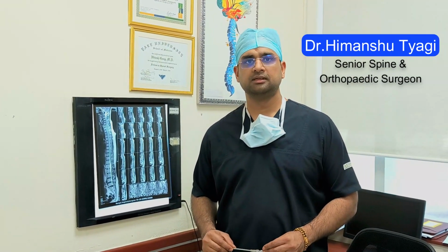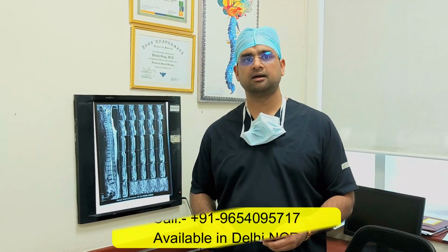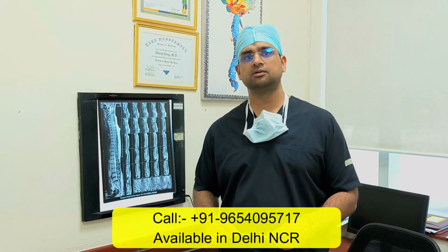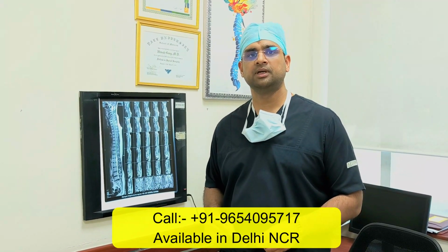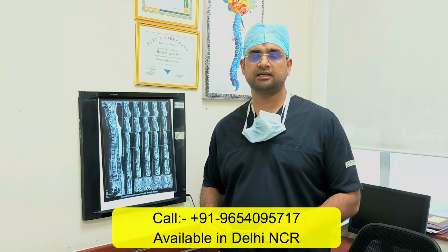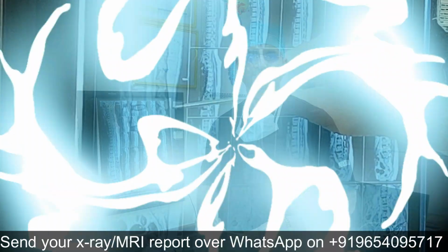A lot of patients come to us and ask about how to see their MRI for slip disc. So basically they want to understand how a slip disc actually looks in an MRI. So come, let's understand through this MRI film what type of slip disc is there and how to identify it.